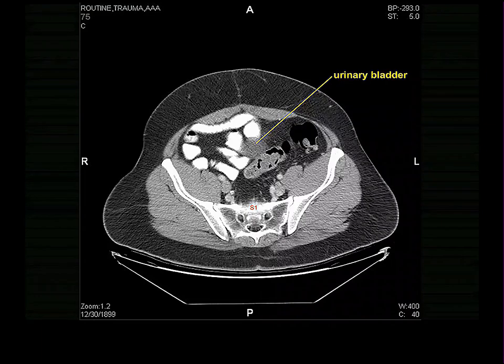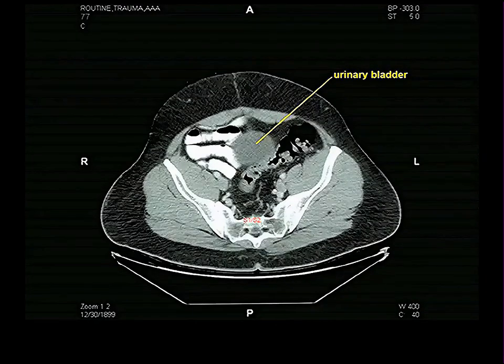When those spread out and become a continuous coat around the outside of the bowel and lose their integrity as distinct linear bands, that's when the sigmoid turns into the rectum, by definition. So the rectum begins when the taenia are lost and the longitudinal muscle becomes evenly distributed. That usually occurs around S2 or S3. So we're up here much too high for that to have occurred. I could never tell on a CT anyway, but I don't usually call anything rectum until I get around the S2 or S3 region.